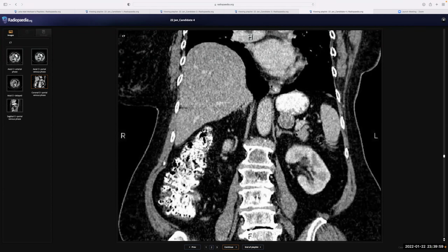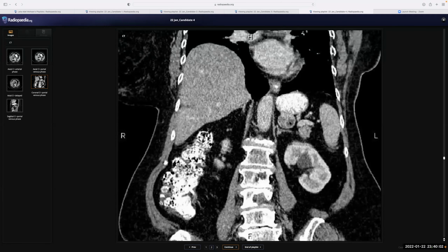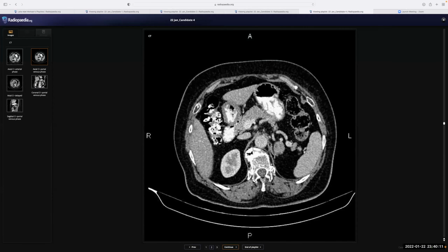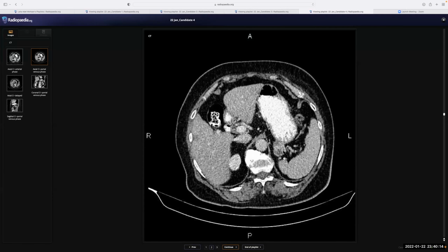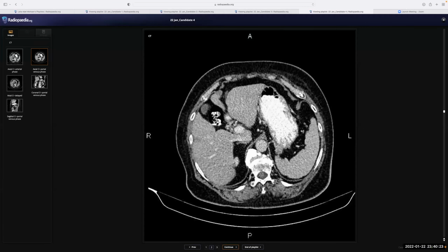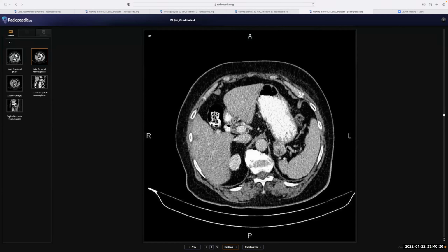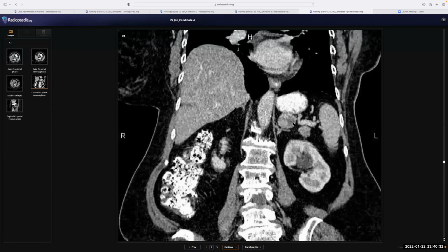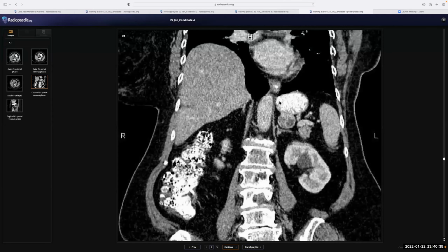Okay, fine. So you are right about this case. It is not suprarenal; in the coronal, and even on the axial just by scrolling a little bit, you notice that it's separate from the suprarenal. It's compressing here. Like you say, metastases in the stomach are likely submucosal. They will not be exophytic like this, but still it is a possibility since the patient is having a known primary already, and GIST is another possibility. I'm not sure about endoscopy, if they can see this lesion. I think maybe if endoscopy is assisted with ultrasound, then it can be seen and targeted biopsy can be taken. And this was a GIST tumor.